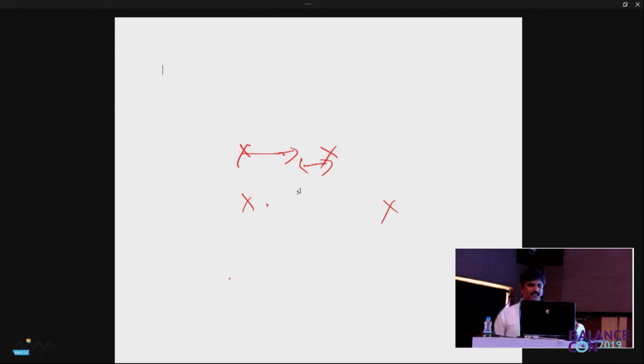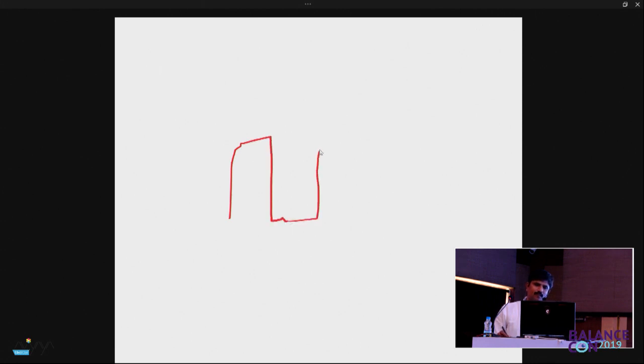When a normal saccade looks something like this, in the normal with a small amount of hypometria, I am writing like this. In this particular saccade, it goes up to some extent correctly. After that, this is the final position.